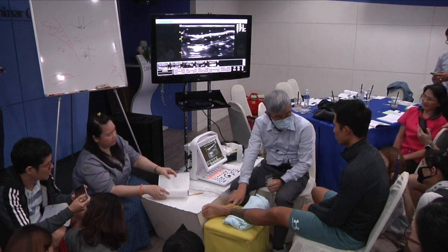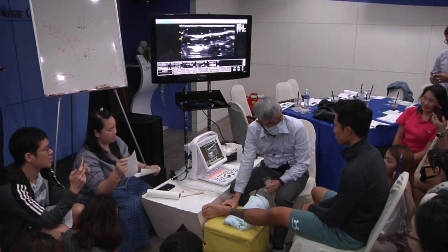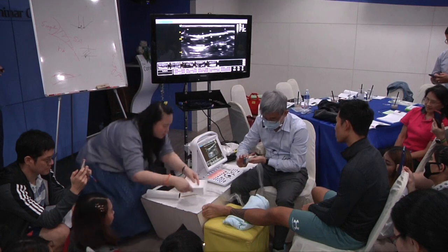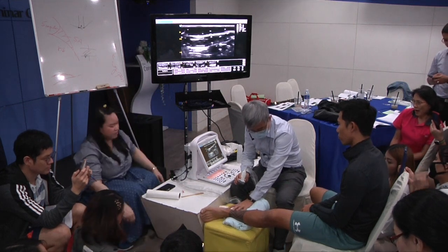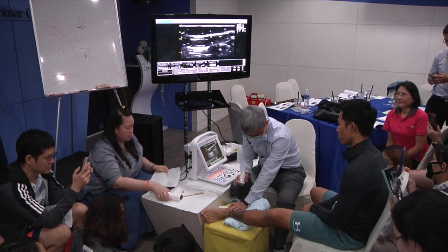Find the medial malleolus. Insertion of the Achilles tendon, right? Medial malleolus. Insertion of the Achilles tendon.